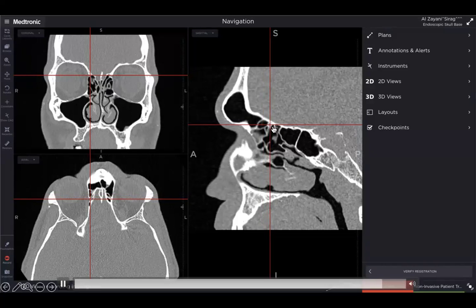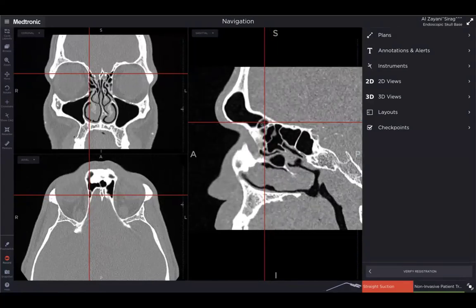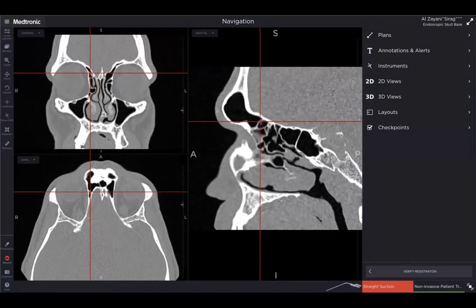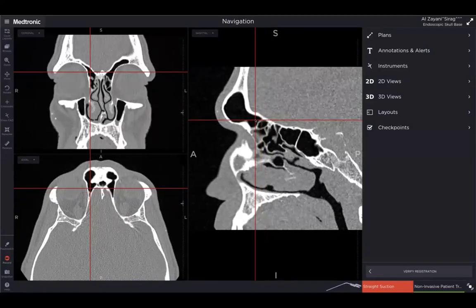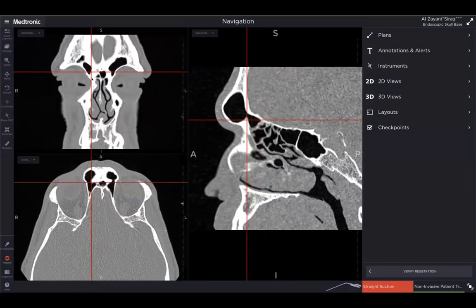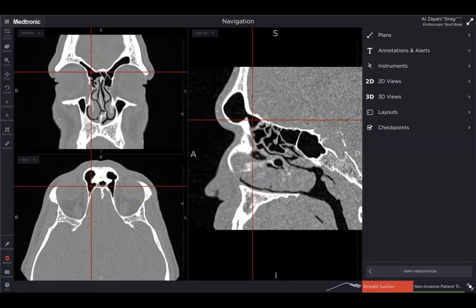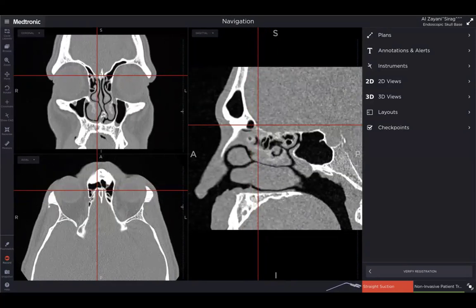So very important to realize that anterior to the anterior ethmoid artery, you'll usually see a cell, and that is the supraorbital recess, which if it pneumatizes, will turn into the supraorbital ethmoid cell. And then after that, the lamella will come, then the frontal sinus. So a lot of very difficult concepts here that I've been through that I really want you to think about.